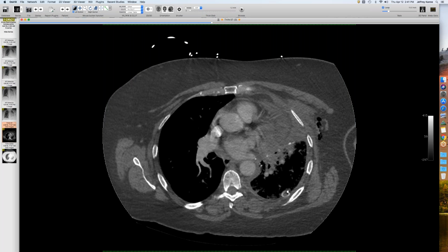But I think, Travis, you showed, or maybe it was Brent, someone showed a case of a venous occlusion. I showed one a long time ago. Yeah, it was a right lower lobe. That's what triggered my memory, because I remember when we were looking at that, you had shown a case, and the lungs should become better aerated, especially as the patient's up and about, and this one was not getting, it was getting worse aerated. It's just interesting. It took several days to really declare itself. It was never normal. Yeah. So you wonder if it was maybe just highly stenotic and eventually thrombosed or something like that.